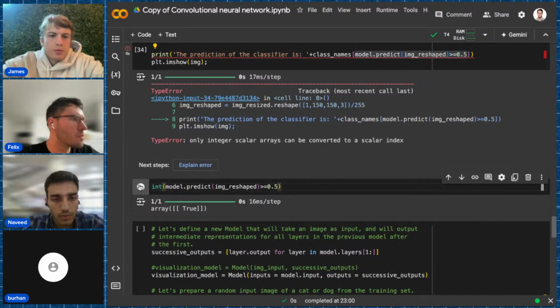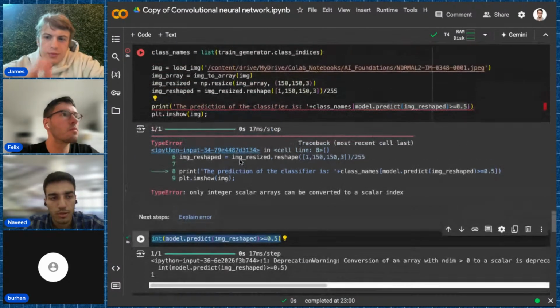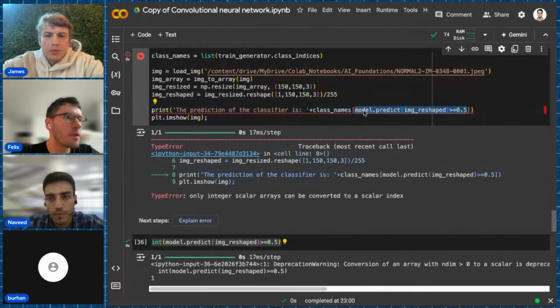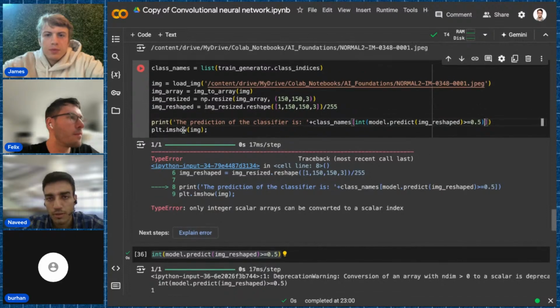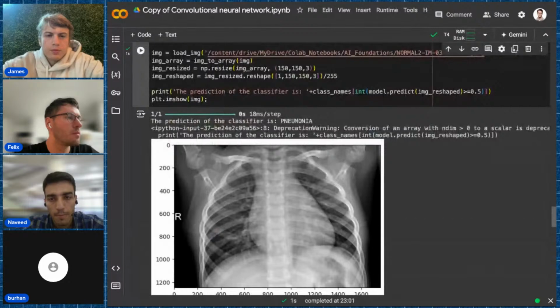Run it now. Maybe it works now. It would work. You need to copy it entirely and paste it in place of whatever was set there previously. Here, yep, just paste it. Within the square brackets, right? Yeah, brackets. Run it now.